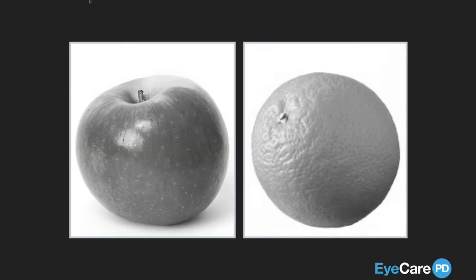This is something that I always like to show people. It really questions how you understand and learn things. How do you know which one's the apple? I mean, it's pretty easy for you to pick out, right? You know which one's the apple. But think about it. These are two-dimensional images in grayscale, and yet you can pick out an apple almost instantly.